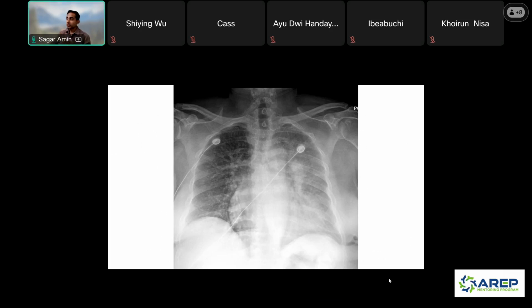All right, so here's a radiograph. Whenever I'm looking at radiographs, it's good to have a pattern in which you're evaluating the radiograph. What I do is I look at the lungs both equally, and then I take one at a time, the right lung and then the left lung.